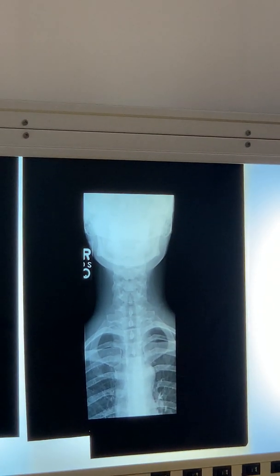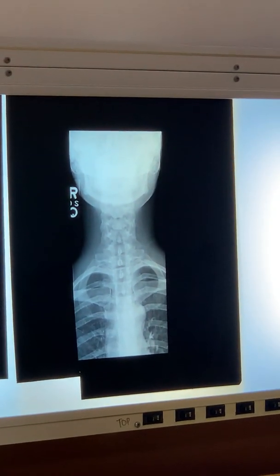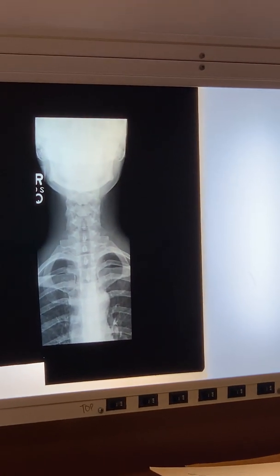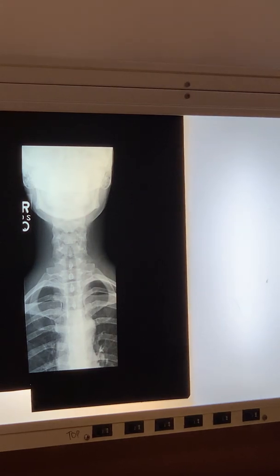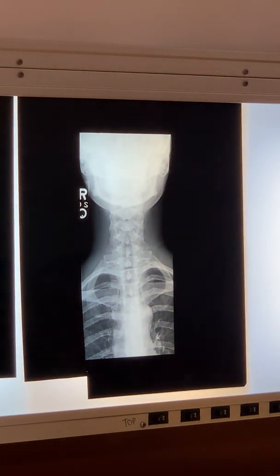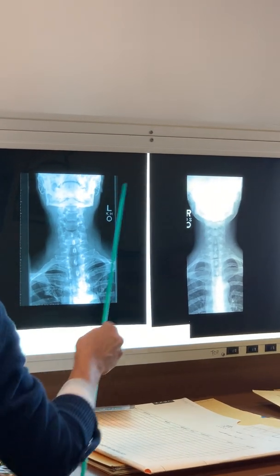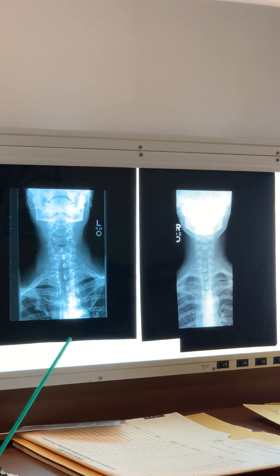Those are really huge over there. Why do they look like they're porous? Because they have little foramina in them. They call them mastoid air cells. Some people have a whole bunch and they're really big, and some people don't. So it's cool, different.